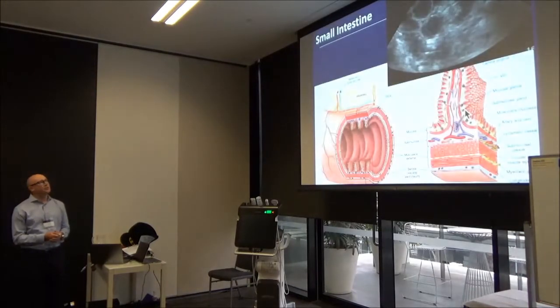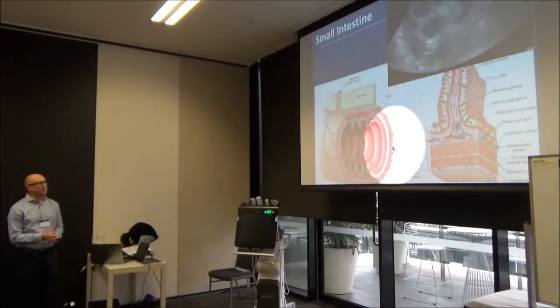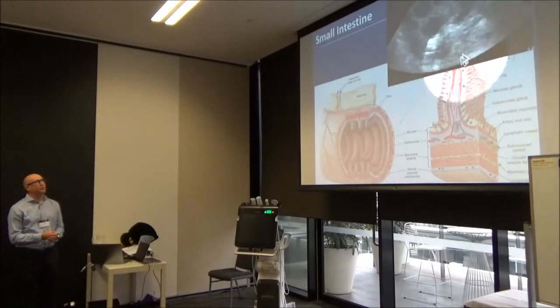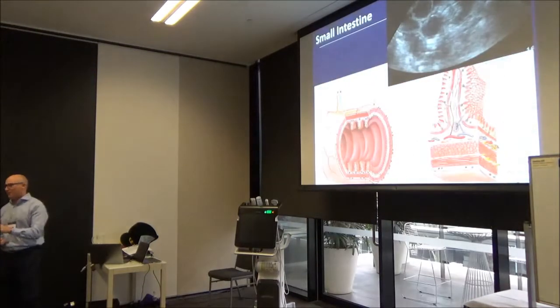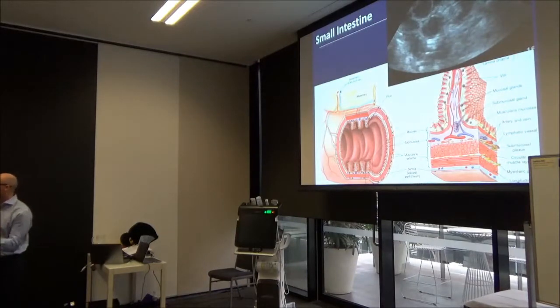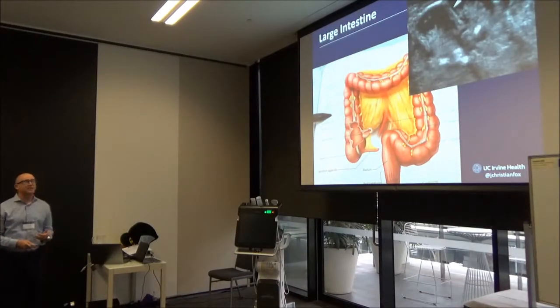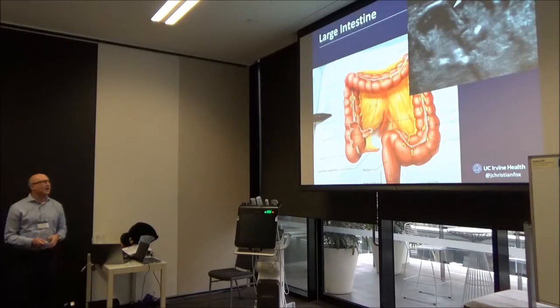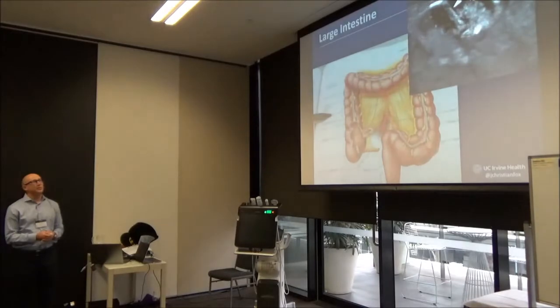And the plicae circularis, it has these rings in the lumen of the bowel. You can see them here in this 3-dimensional drawing. And you can see them sometimes if you do have a small bowel obstruction. You'll see the plicae stretching out across the screen as you get towards the edge of the bowel. You're sort of off the center of its axis, off to the edge of it, and you'll see the plicae over there. As opposed to large intestine, where you get these haustra, okay? The haustra are these little areas, these folds that come down here.